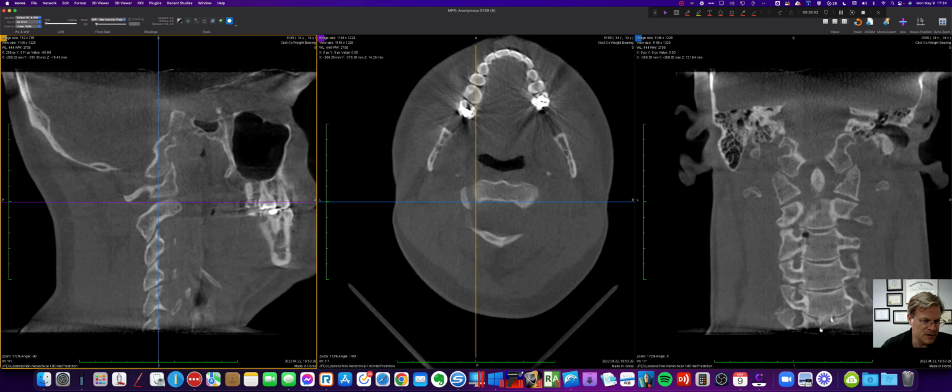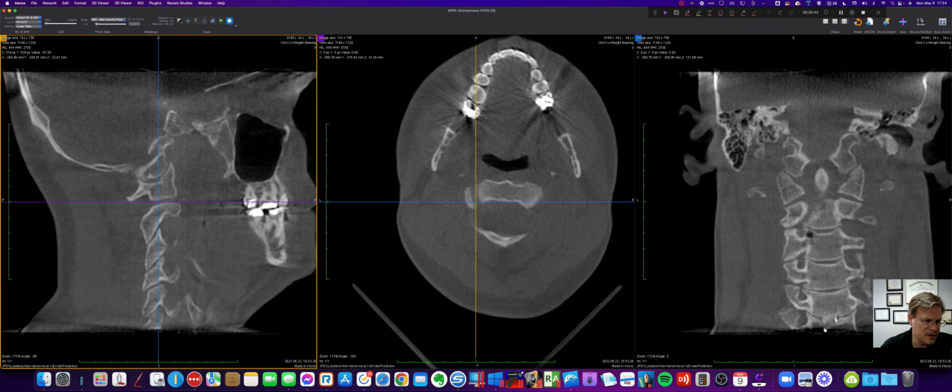Here we are over on the left side. And it looks like there's some weird, funky stuff going on there. So let's take some measurements. We're going to go boom, boom, straight out. Let's make sure. Yep, good. Now, instead of having to recheck everybody's straight lines, I'm just going to copy that. There's 2, 3, 4 more joints. So I just did Command C and Command V. Command C once, Command V 4 times.